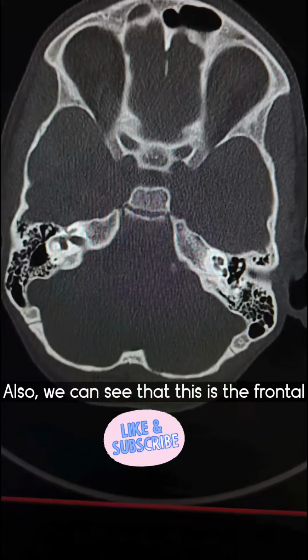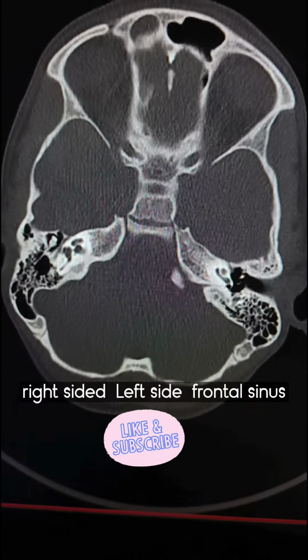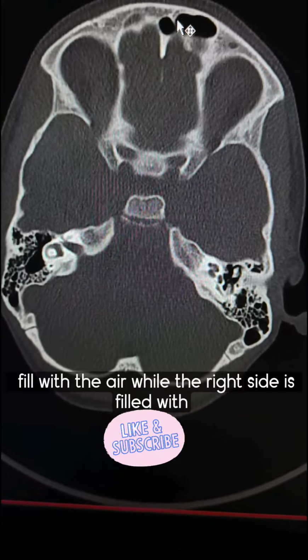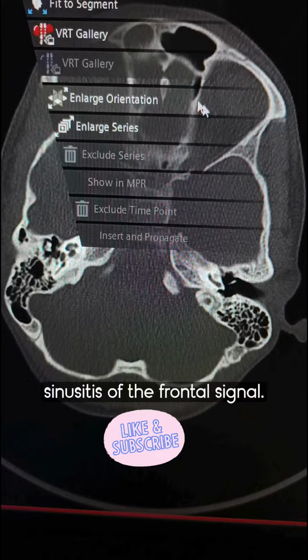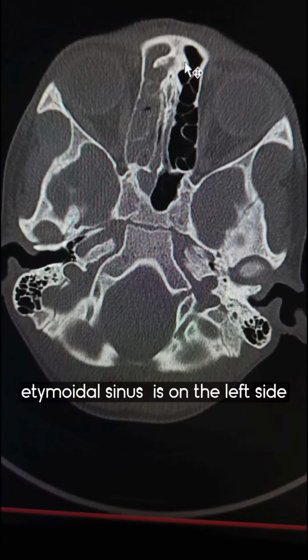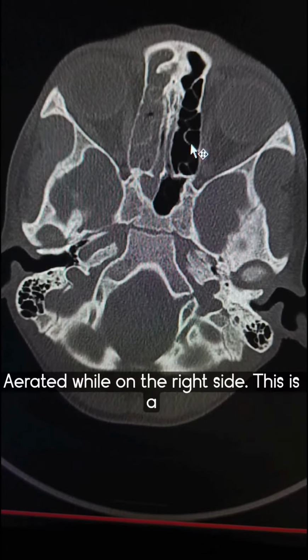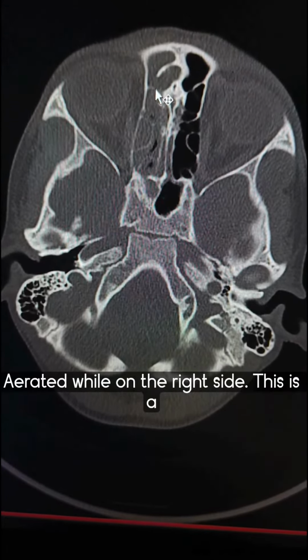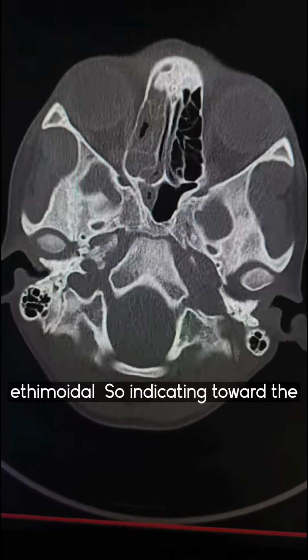Also we can see that this is the frontal sinus, this is the left side, this is the right side. Left sided frontal sinus is filled with air while the right side is filled with soft tissue density, indicating sinusitis of the frontal sinus. Also here this is the ethmoidal sinus. Ethmoidal sinus on the left side is well aerated, while on the right side there is mucosal thickening noted in the anterior and posterior ethmoidal cells, indicating sinusitis.